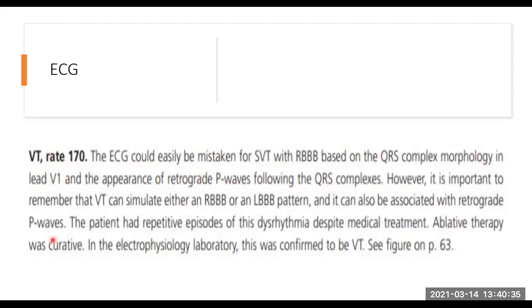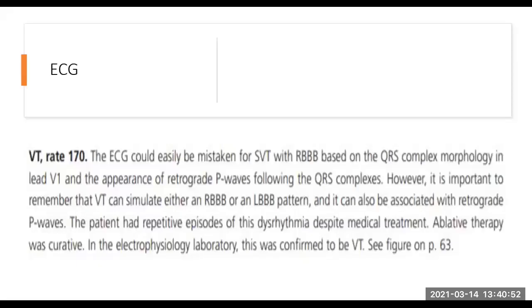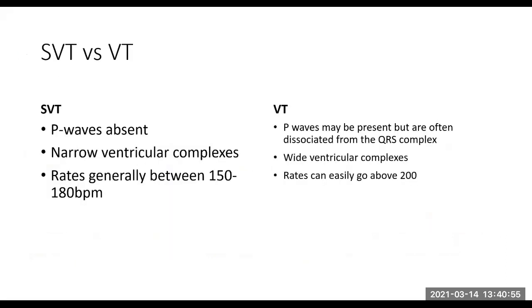The important thing is to remember what a ventricular tachycardia looks like. And if you can remember nothing else, just remember vampire's teeth, all right? Especially if you turn this upside down, it looks exactly like vampire's teeth. So try and remember that that's what a ventricular tachycardia looks like. Okay. So ablative therapy, why? Because you want to remove the electrical pathways.